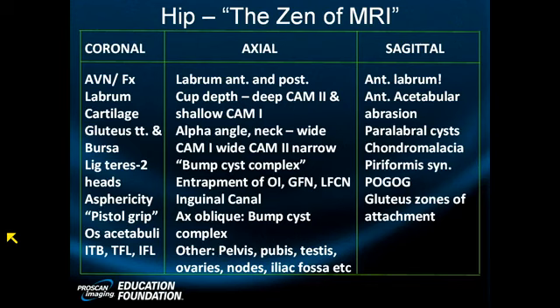Sagittal, a little challenging. As you get a little medial on the sagittal, there's something right there, but it's the radial that really does it. Right there. Through and through. I'll blow it up for you. How tough is that? That's your tear.